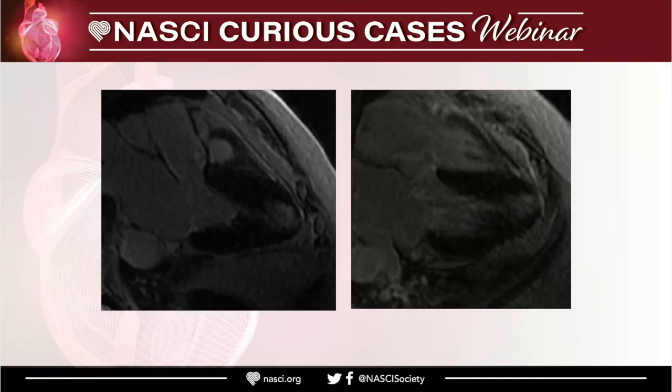So these are the post-contrast LGE images where we can see the LGE is centered within the area of the hypertrophied apex, and on our semi-automated quantification method, we saw that the LGE involved around 10% of the myocardium. As we all know, we need to quantify the amount of LGE because the functional status based on EF, based on LGE quantification, the further management differs.